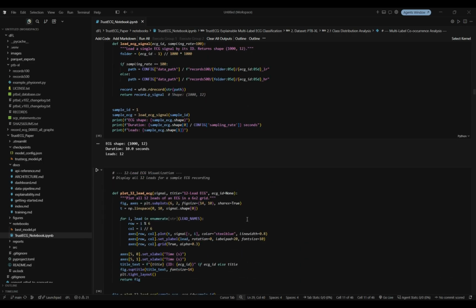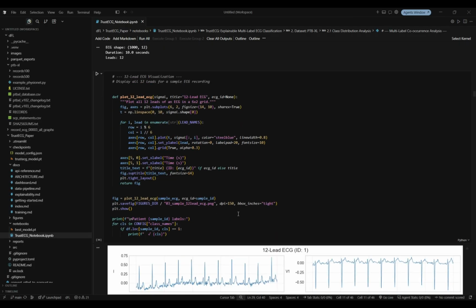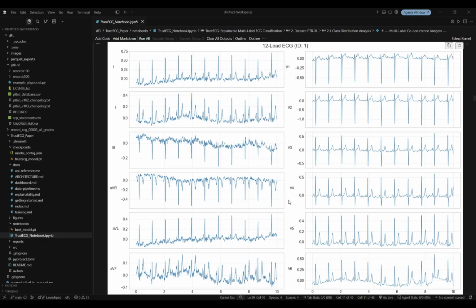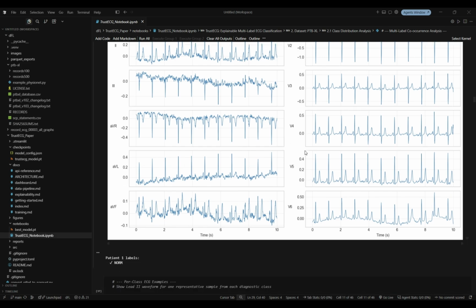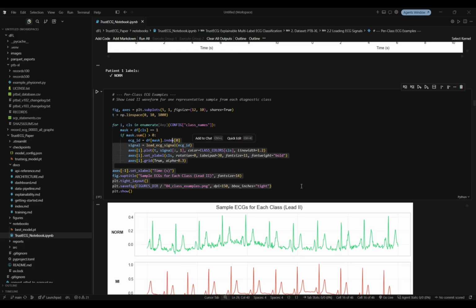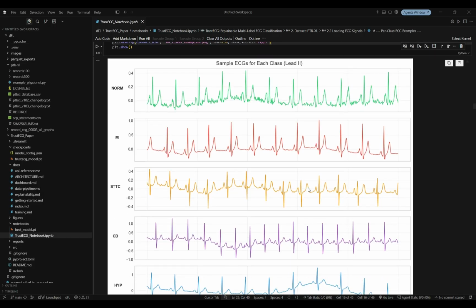Labeling was the other big pain point. I was using matplotlib to plot the ECG, manually picking a start time and an end time on the graph, writing those down, adding them to a CSV by hand. For 21,000 records, that's not going to work. So I started looking for a better tool, something that would let me explore the data visually, adjust preprocessing at runtime, and label things without writing a new script every time.